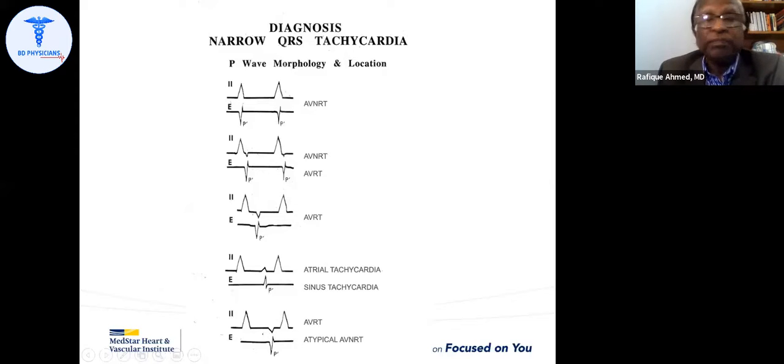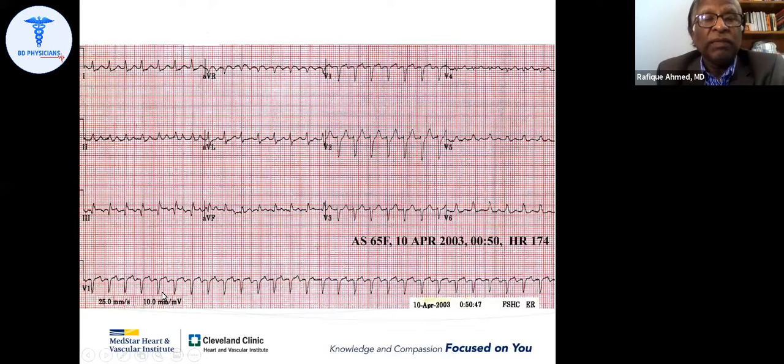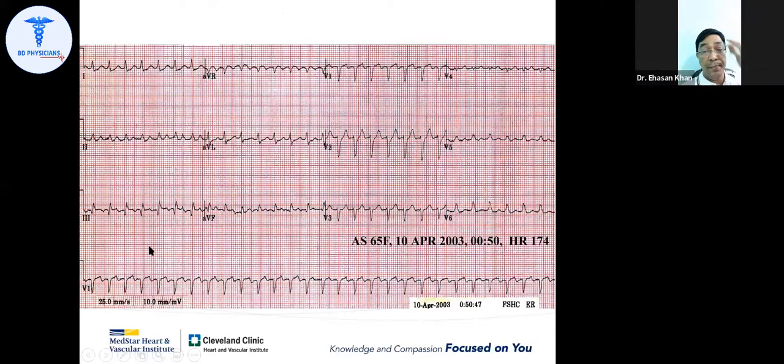So this one, somebody wants to do this one? Heart rate 174 beats per minute. Dr. Saifullah. Dr. Saifullah Razin, please.